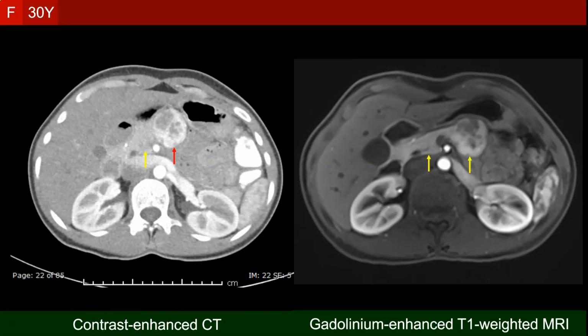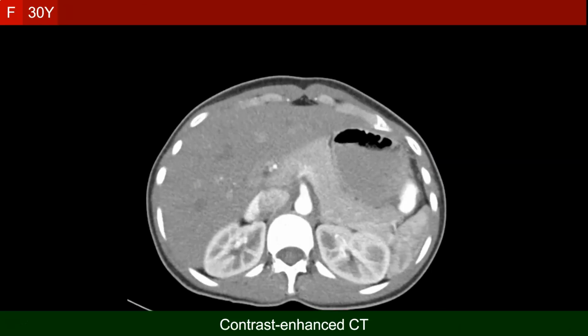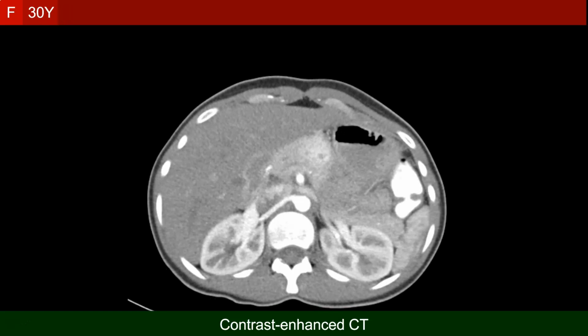Clear with the splenule? What is the story of the first lesion then, the Castleman's disease? It has also ample intravascular space, particularly the vascular hyaline type, which was the exact histological diagnosis in this case. Let us have a closer look at the contrast-enhanced CT of this case. A strongly enhancing lesion at the undersurface of the pancreatic body.